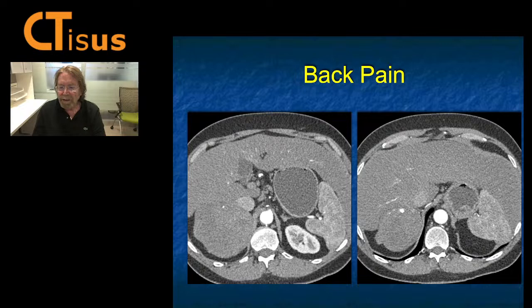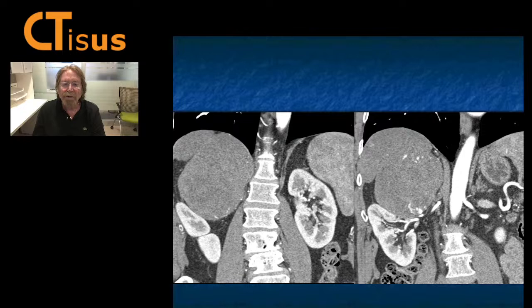Patient with back pain. There's a large mass by the right adrenal bed. I guess you couldn't say it wasn't the kidney here, but when I show you the next image, it's pushing on the kidney, so it's the adrenal. There's some vascularity at the edge of the lesions, and now you got a big vascular lesion, or partly vascular, and solid. Pheochromocytoma is the thought, but they're usually very vascular or they're cystic. I don't like pheo. Could be an ACC, primary adrenal cortical carcinoma. They're typically solid, though they can be cystic, can have lots of vascularity. That's a thought. It could be metastasis, hepatoma, melanoma, often mets are bilateral, but they can be unilateral.